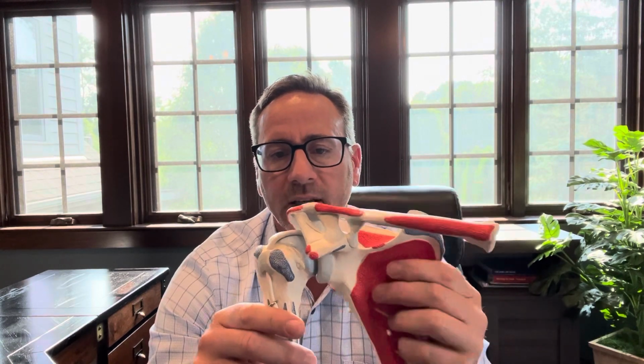The weakest link of the shoulder replacement is always the socket. There's very little bone on the socket when compared to the proximal humerus. So if I pull up an implant that demonstrates a standard shoulder replacement and we look at the socket, it's a highly specialized piece of plastic that gets cemented into position onto the socket. And this is a lifelike representation, and you can see the socket is very small when compared to the ball. So both surfaces are replaced.